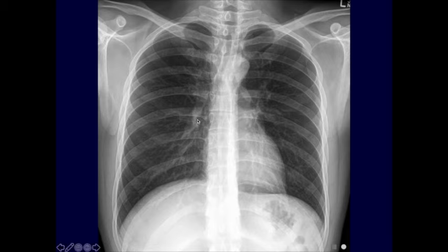In order to pick up a reticular abnormality, it's good to know what the normal vasculature looks like. I generally split the lungs into thirds. We have the medial third, the middle third, and the peripheral third. As you move out peripherally, you're going to have less and less markings, as you can see from normal vessels. In the peripheral third, you should have next to no or no markings in a normal situation. If you see too many lines here peripherally, that's abnormal.